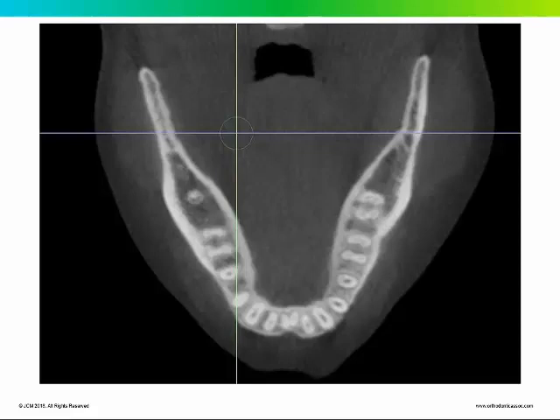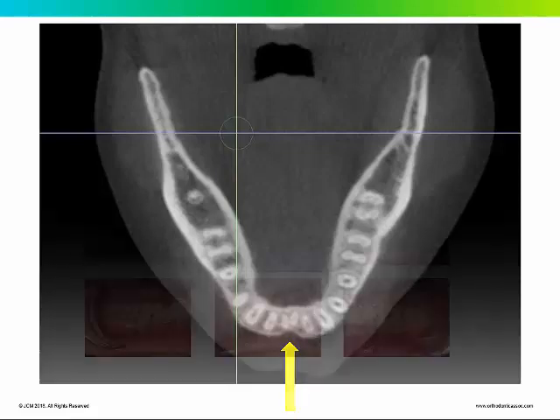This is an axial view taken halfway down the length of the root, and you can see this clefting of the bone associated with the two central incisors. Bringing those central incisors forward may cause dehiscence in the cortical plate, and knowing that information I think is important for anyone moving teeth orthodontically, whether it's through aligners or fixed appliances.